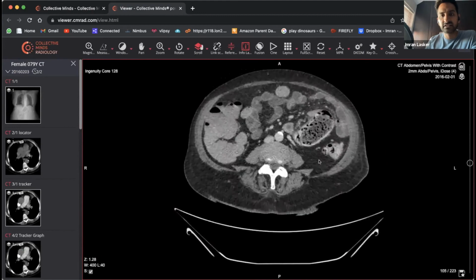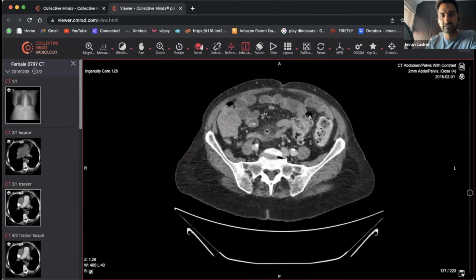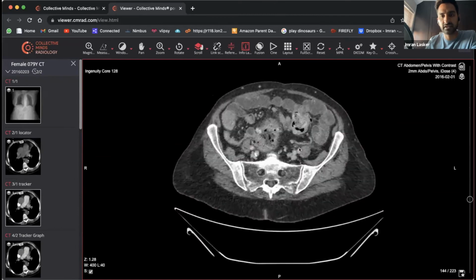well. So as you scroll through now, hopefully you can see that there is a difference, isn't there, around the fat. So fat, fat, fat, fat, fat, all looks okay. Get to here, it looks very, very hazy. So if I'm saying it's not diverticulitis, then what could it be?